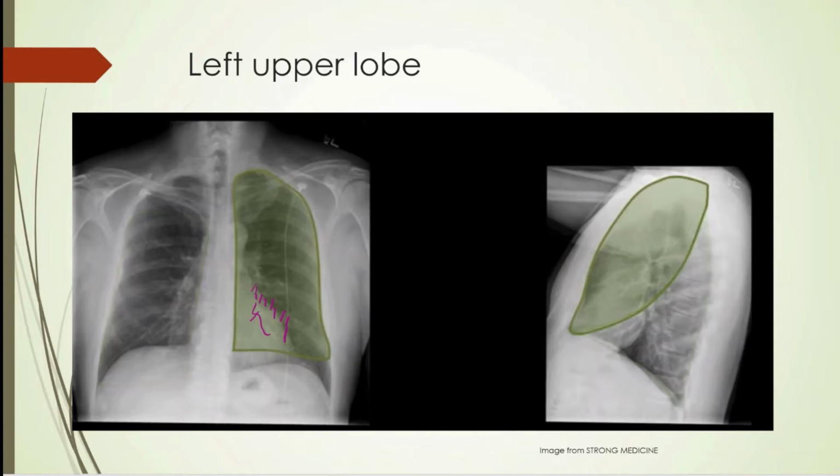And the same thing over here on the lateral. If the heart's obscured, or the upper portion of the vertebrae is obscured, then that tends to direct you to thinking about an infiltrate and what's causing the infiltrate.